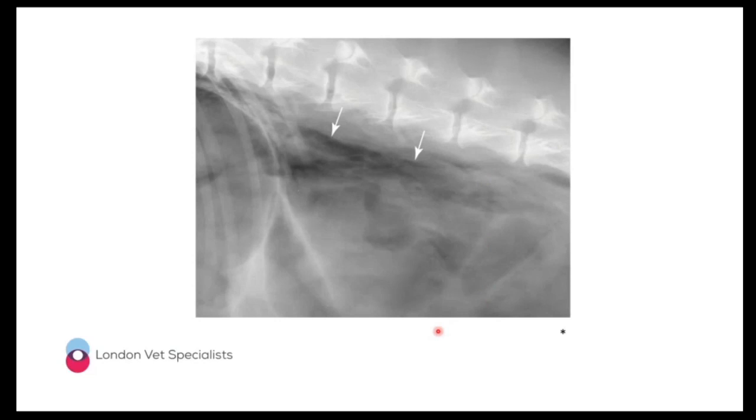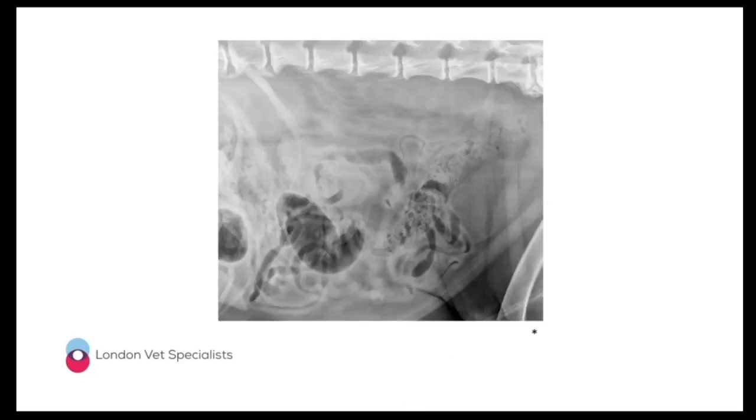Commonly, this can occur secondary to a pneumomediastinum. So the retroperitoneal space, as we said, communicates cranially with the mediastinum. If you have gas within the mediastinum, then you can have gas tracking from the mediastinum into the retroperitoneal space. So that's an example of a pneumoretroperitoneum.